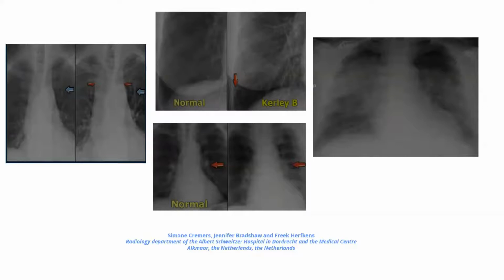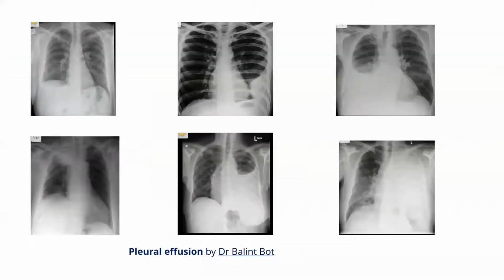It has stages. So if you have a patient with decompensated heart failure, don't expect you are going to just see a chest X-ray like this or even like this. The patient might just be at this stage or the Kerley B-line stage. So you have to scan the chest X-ray carefully and thoroughly before you dismiss the patient as having no radiological evidence of congestion.